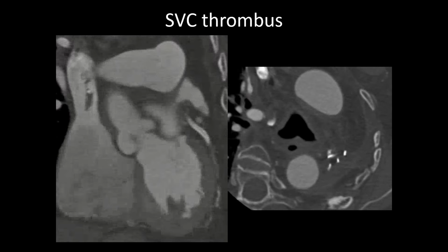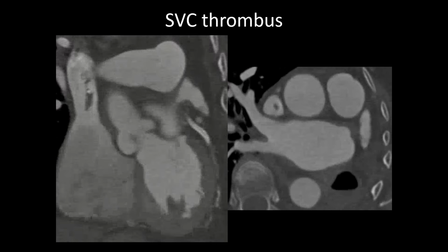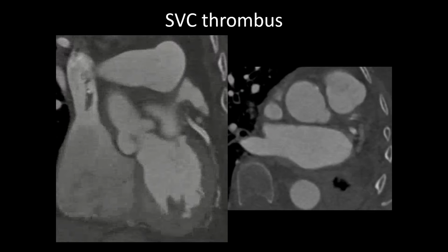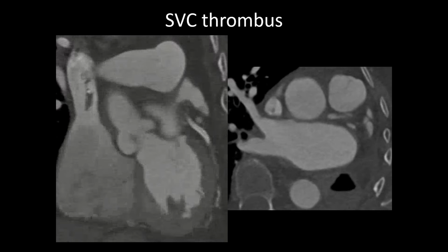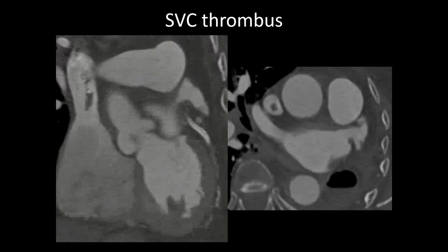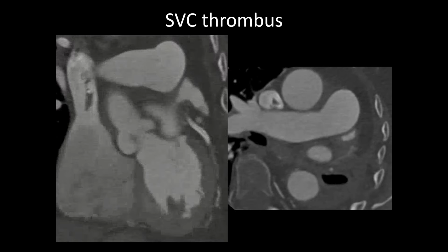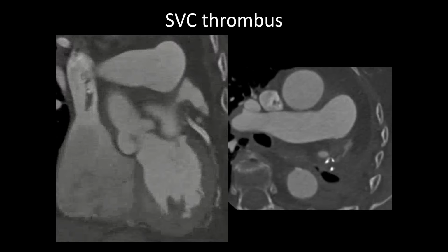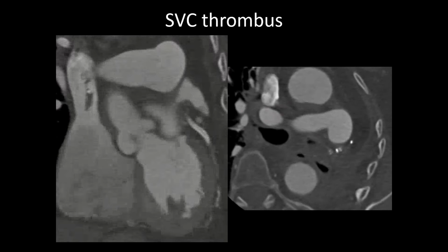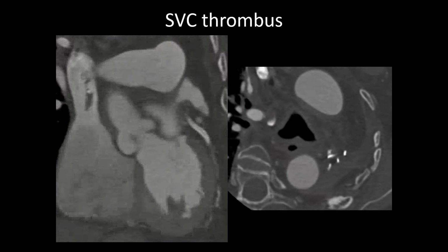I have other pictures, and you can see extensive venous collaterals around her chest area. So this is a chronic process, and I think this thrombus never resolved and has continued to extend. She's someone that just needs to be on lifelong anticoagulation therapy. And there's no direct evidence that she has recurrence. She does have a weight loss history, so there's always the inevitable. But I think she's followed up with her hematologist, oncologist, and so far she's still in remission. So we'll go with that for now.